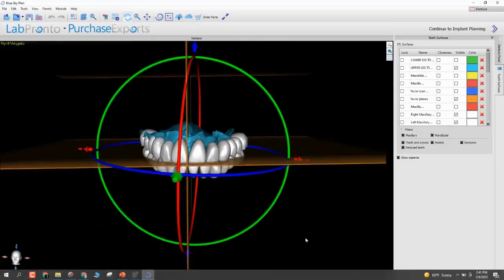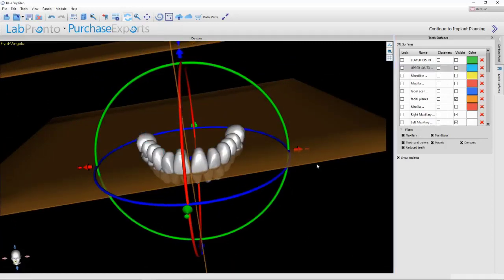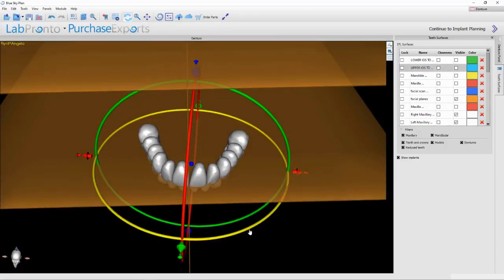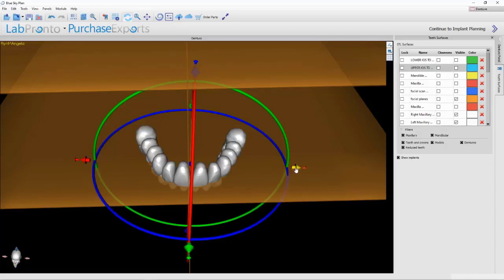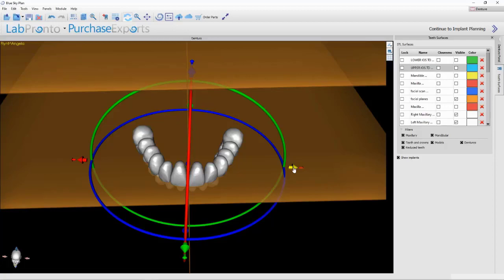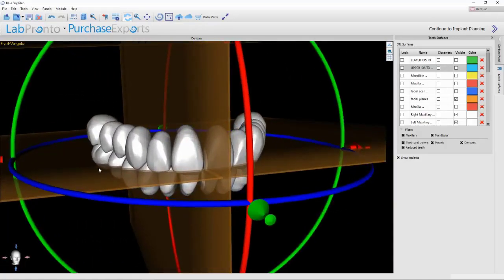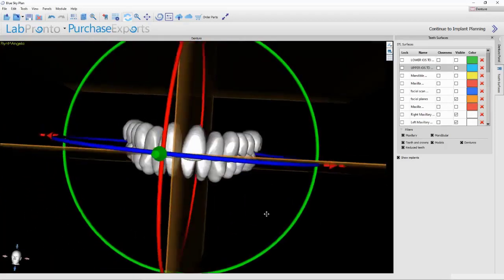Now you're going to see why this is so valuable. You know, I can almost do this entire setup with complete disregard for where her STLs even are. You know, I could line these up symmetrically. I could position the midline going right through the middle of that. I could, let's see, I need to bring this slightly over. Up there. Okay, now we're aligned to facial midline.